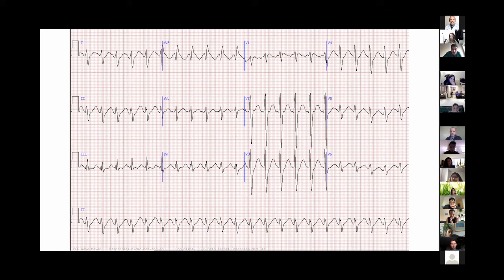Tell me then the final diagnosis, in the sense of what is the atrial rhythm and what is the ventricular rhythm? Just whatever tachycardia, just give me. It looks like there is sinus node atrial. That's absolutely correct.